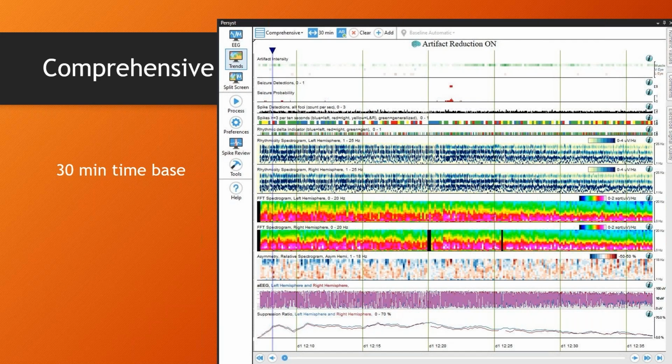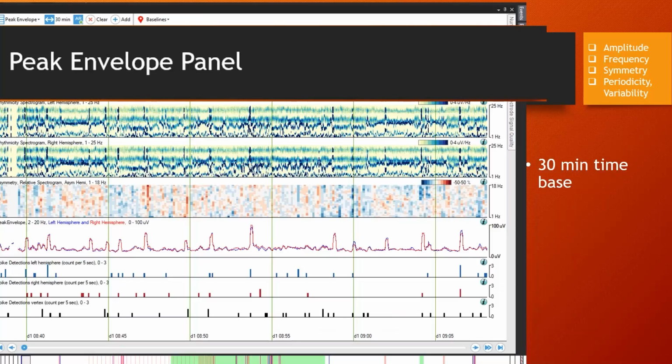This is actually a 30-minute period of the burst suppression. And because it's just consistent bursts throughout, you actually can see it a little bit in the spectrograms, but it's a bit tougher to see it in the spectrograms. It is there, just tougher to see.